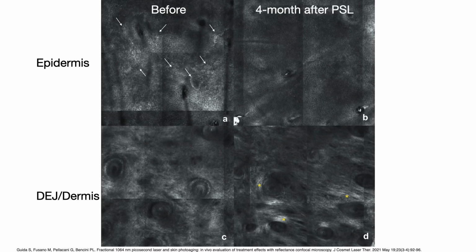So this is a kind of reticular collagen that we can observe not at baseline, but just after treatment, as a result of the effect of the laser at dermal level. So we can see a kind of deposition of new collagen occurring after the laser treatment. This correlation with new collagen deposition has been hypothesized in the papers by Longo and Pellacani.